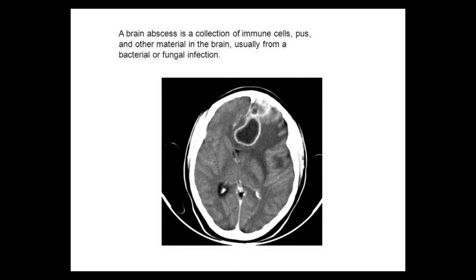This is the case of brain abscess, where there is a collection of immune cells, pus and other materials in the brain, usually formed by bacterial or fungal infection.